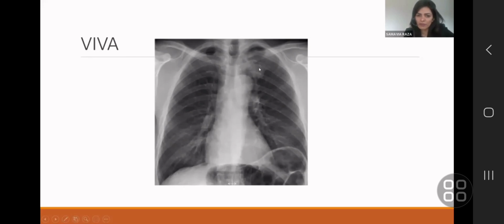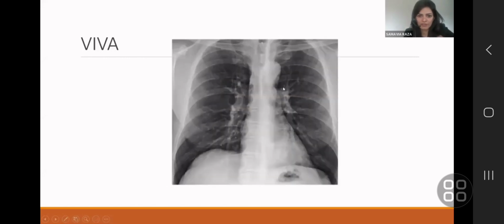This bit I told you is usually normal, but what I told you was symmetry is your best friend. Old films are your best friends. So on this one, you have to look closely at the other side. The likelihood of costochondral junctions being this asymmetrical is a bit unusual. So you would think, is this actually a costochondral junction? If I magnify it, the rib goes like that, and then there is this nodular appearance. So this is indeed a left upper lobe tumor hiding behind the costochondral junction. This is the last one. So open for 45 seconds, please.